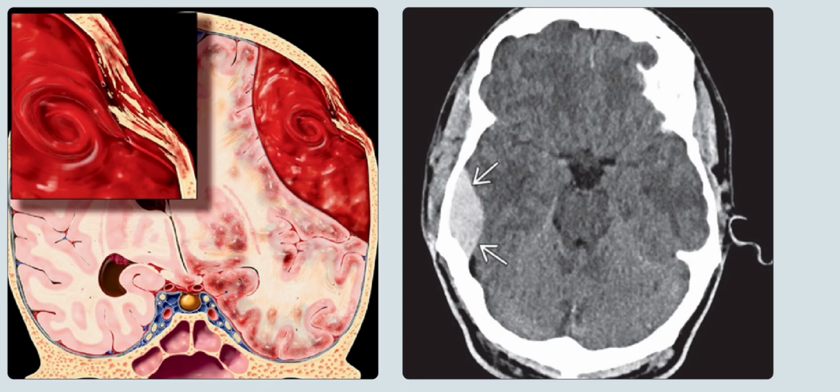The right is the axial non-enhanced CT scan in a 47-year-old man with head trauma, and it shows a classic biconvex, lentiform, uniformly hyperdense epidural hematoma in the right middle cranial fossa. Bone CT scan, which is not shown here, disclosed a non-displaced skull fracture underlying the hematoma.